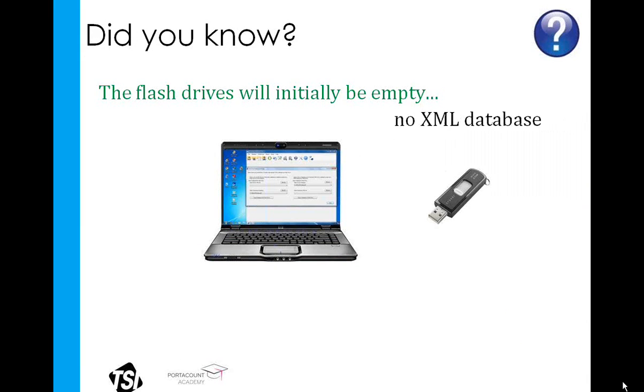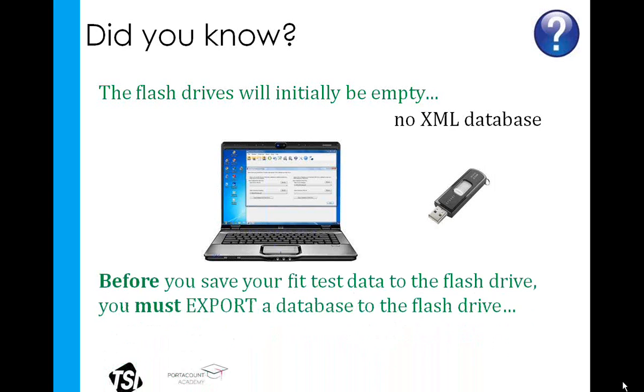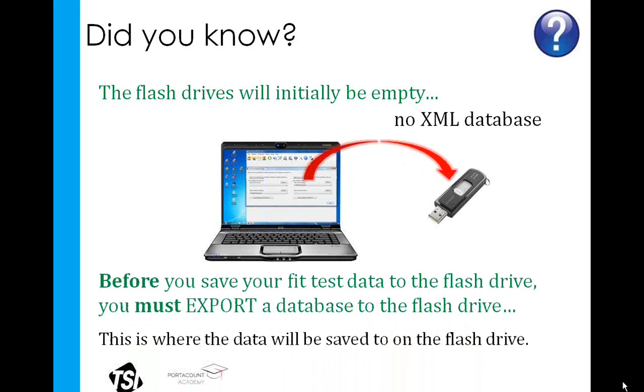Now, a flash drive that is brand new, or at least one that is new to fit testing, will not come with a PortaCount Pro database installed on it automatically. Obviously, without a database to save data into, we cannot save the data. So that being said, our first priority before we begin fit testing in standalone mode is to create an XML database on that flash drive.